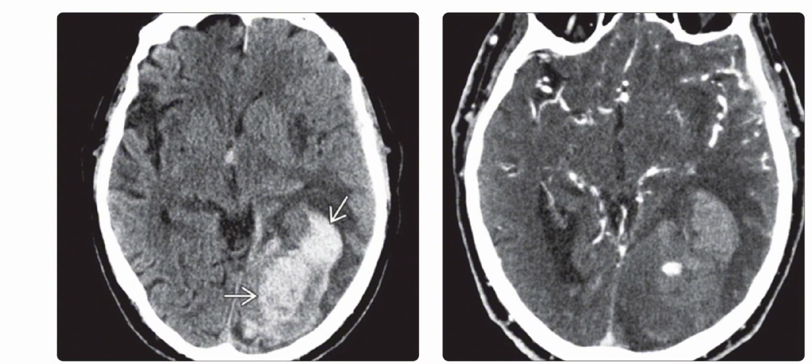Emergent CT angiography was performed in the same patient. It shows contrast extravasation into the hematoma, which is also called the spot sign. It indicates active bleeding. Surgery disclosed an actively bleeding hemorrhagic metastasis that was from adenocarcinoma.